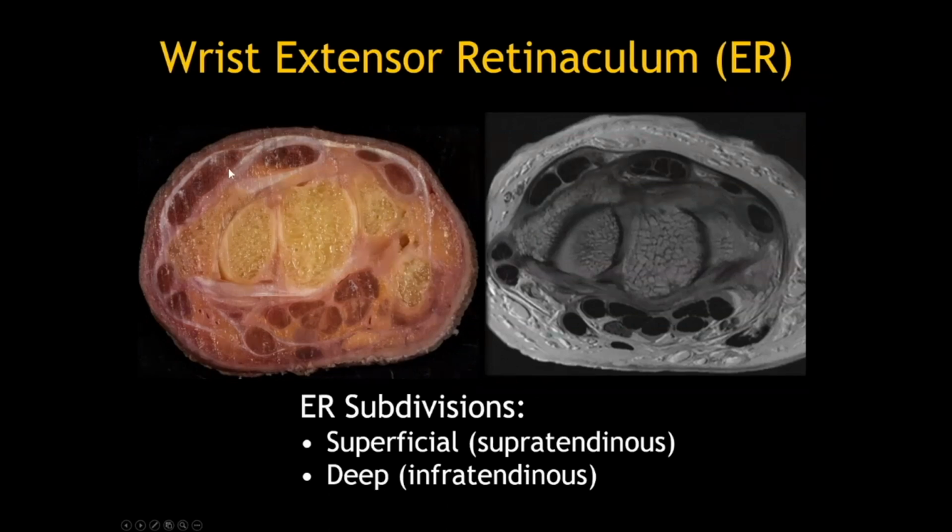as the supratendinous retinaculum. And one more thing that you may observe on this image is that this extensor retinaculum is in fact continuous with the flexor retinaculum of the wrist, again being a distinct thickening of the antebrachial fascia of the forearm. Likewise, you can see this on the corresponding MR image in this cadaver, and you can see particularly over the fourth dorsal extensor compartment that this extensor retinaculum is very well formed, where it measures up to 1 to 2 millimeters in thickness.